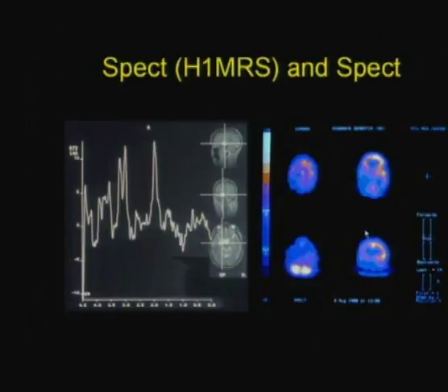On the coronal view, you can see that there's been extension of the changes to the parietal parenchyma, more so on the left side than on the right. And these are corresponding cross-sectional images.